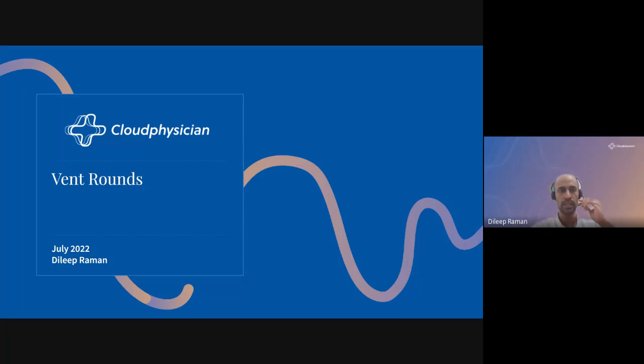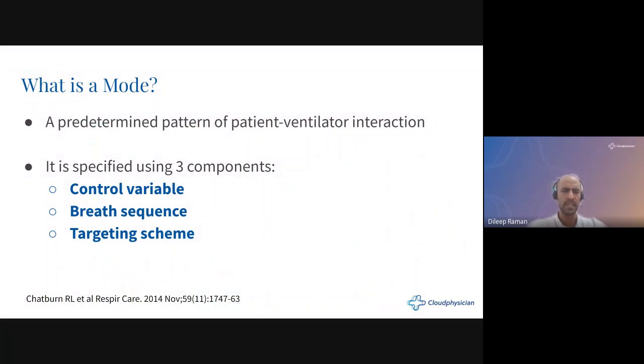You actually name the ventilator mode. So this will be a little bit more advanced. This will be an advanced version of the vent round session, looking at more finer details of a ventilator screen. So we'll proceed. Basically, ventilator modes can again be broken down into three pieces.